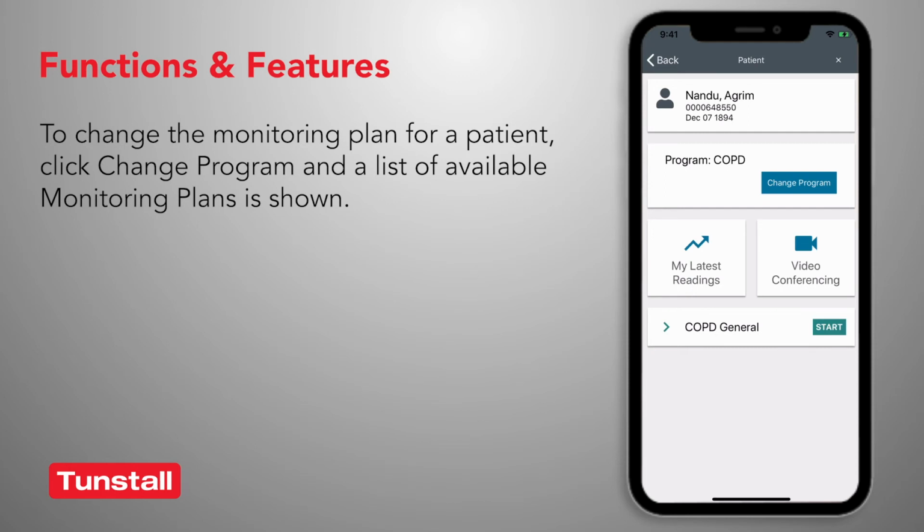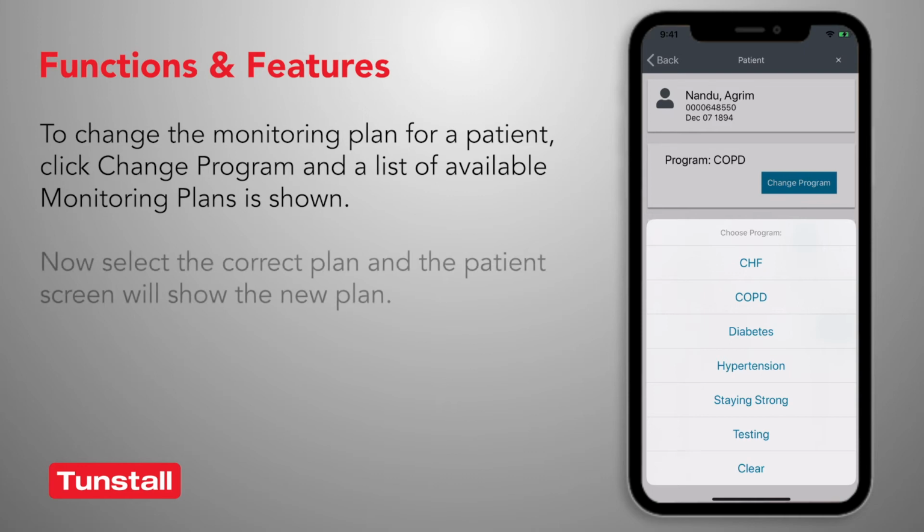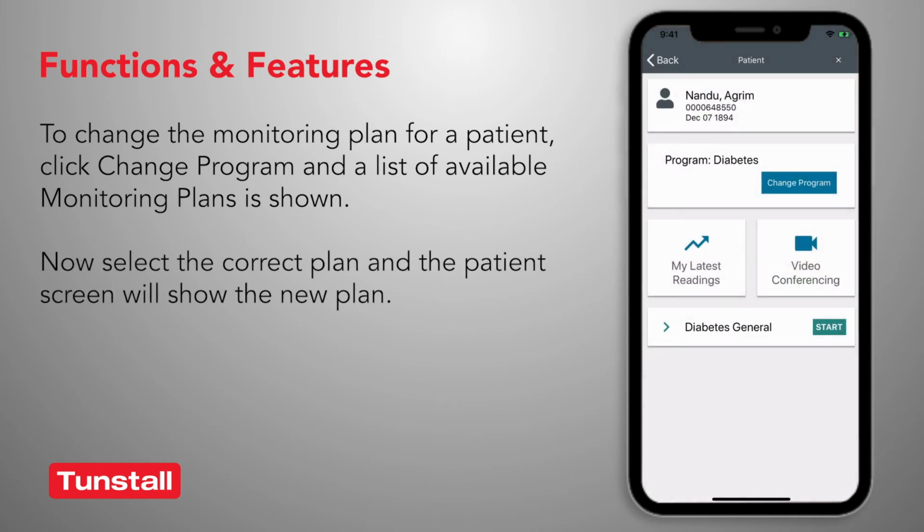To change the monitoring plan for a patient, click Change Program and a list of available monitoring plans is shown. Now select the correct plan and the patient screen will show the new plan.